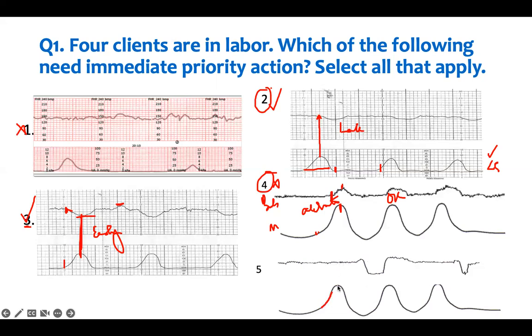It's in the baseline. And then before the beginning of the contraction of another one, it just went all the way down. It doesn't correspond really well. It's like in the middle, not late, not early, and sometimes in the middle. The same thing happened here. Contraction has completely finished. It has finished before the baby's heart rate comes down.